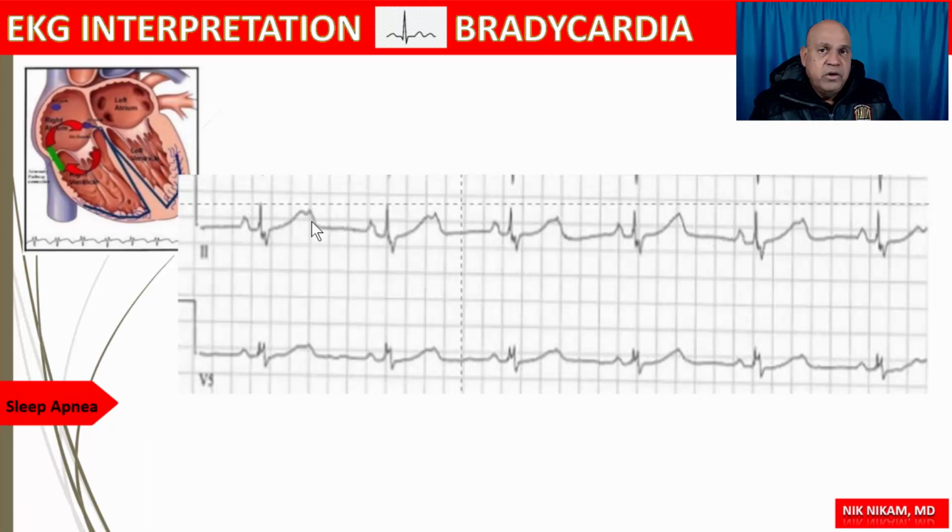There's a notch on top of the T wave here, here, here, and we don't see that well here, but here we got a normal beat. So the moment we see these notches, the moment we see distortion of the T wave, then we need to see if we are looking at multiple P waves between the QRS complexes.